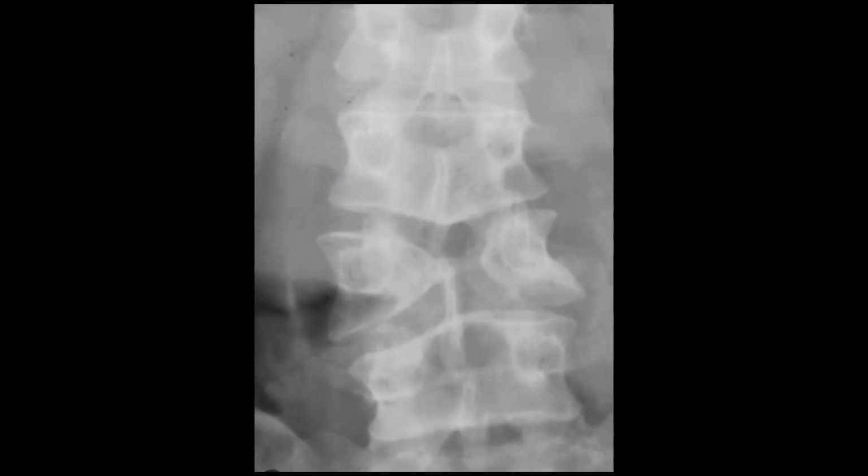Congenitally, the vertebra will appear as a butterfly, and there will be a ring epiphysis, a very classical appearance, and I'm sure you will not miss that on an AP radiograph. It can be easily seen. Some abnormalities can be picked up on the lateral, but in a few examples the AP is clearer than the lateral. As far as the butterfly vertebra is concerned, it can be seen very beautifully on the AP images.